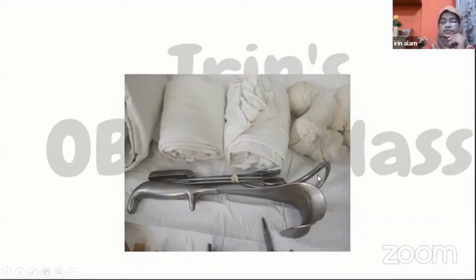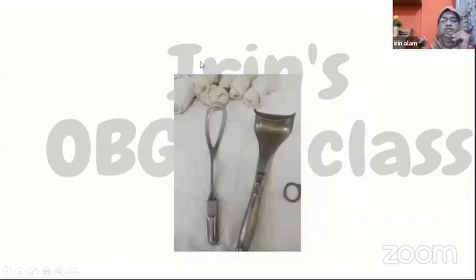And this is the forceps. Forceps is given in the cesarean section trolley because sometimes we use this instrument during cesarean section. If the head is floating, it acts as a vectis and helps to elevate the fetal head.